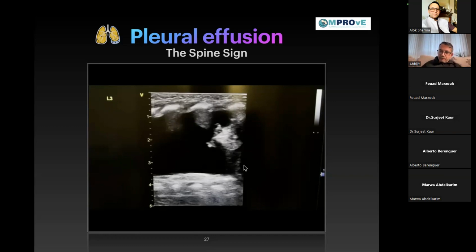Sorry, I didn't get the whole part of the question, but if I've understood right, if it is a chylothorax, do we see the blood vessels on the Doppler? Is that what you mean? Yes, exactly, and there is no shred sign definitely. So would it be just collapsed lung with static air bronchograms and no positive Doppler on the Doppler examination?